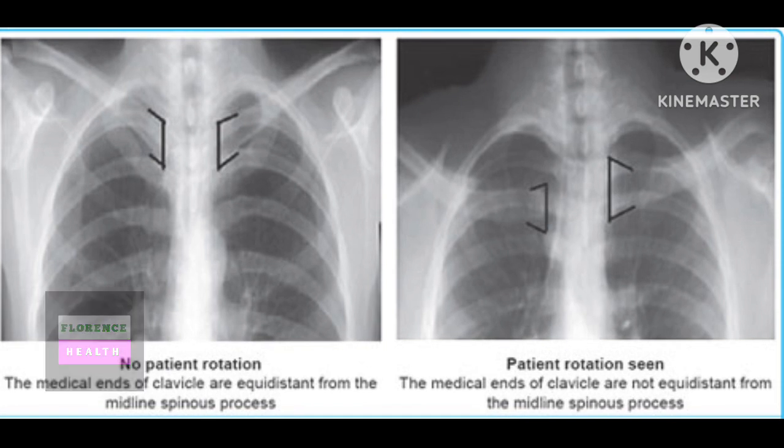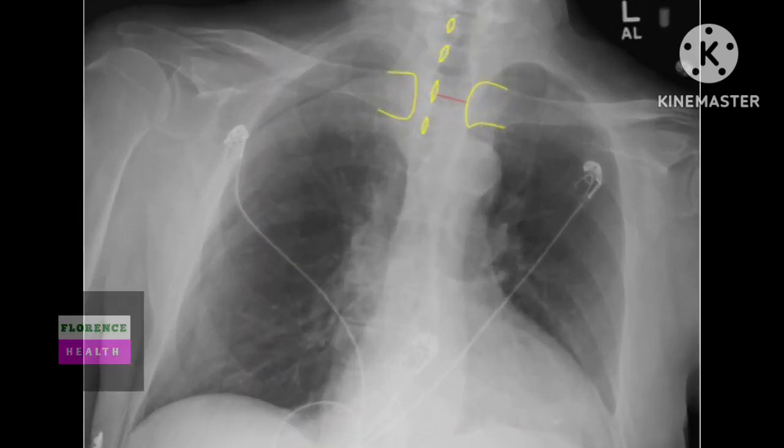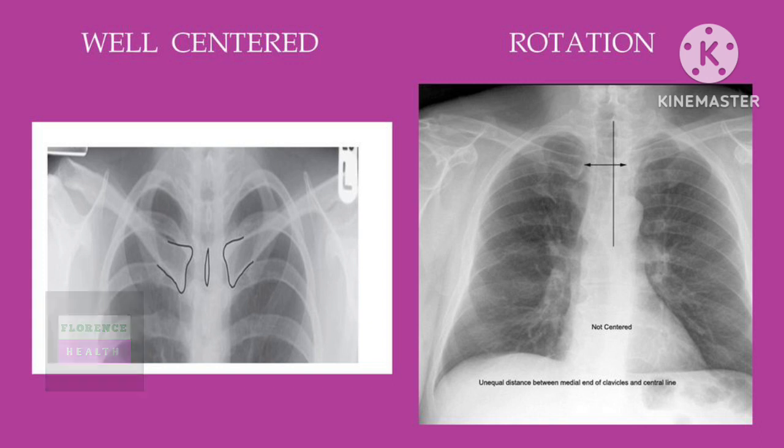Guess which is rotated and which is non-rotated X-ray.